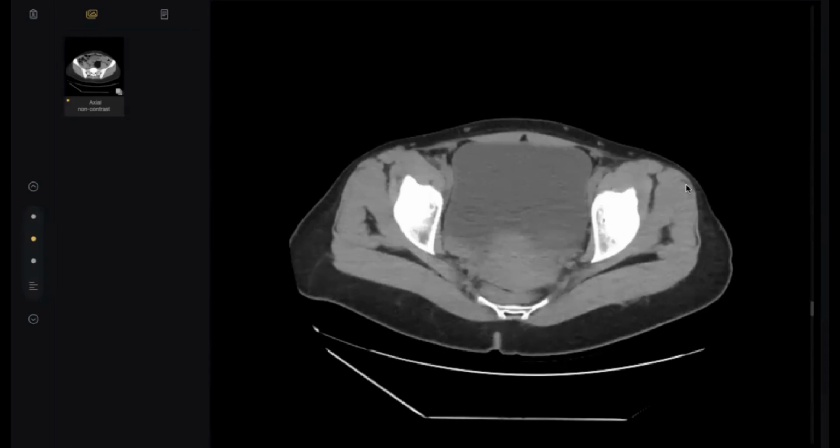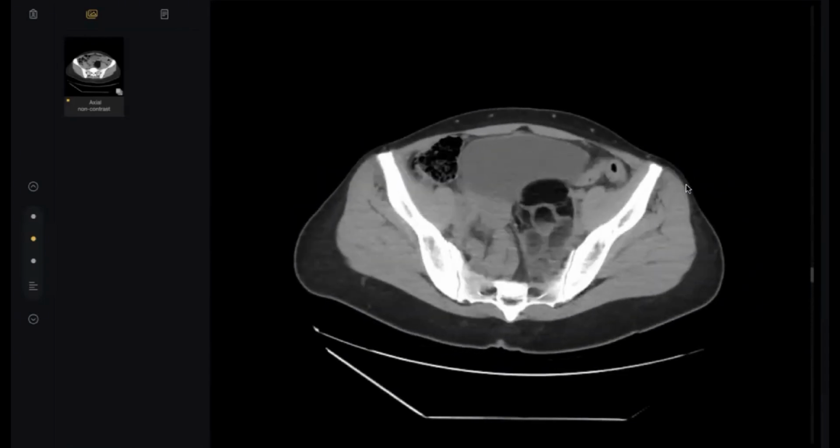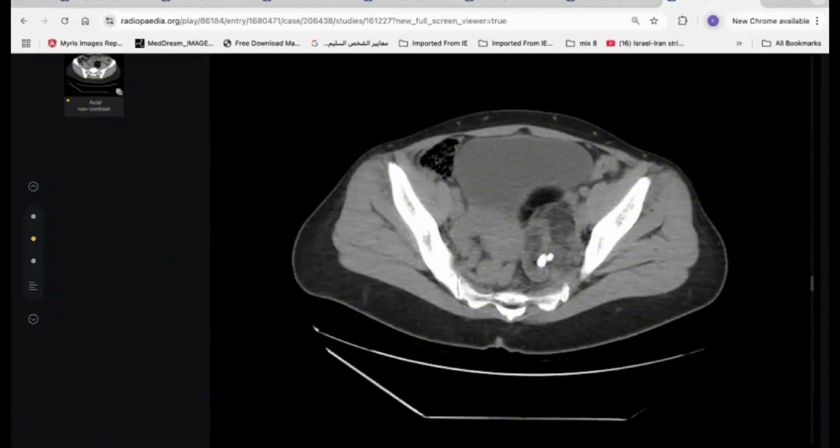Why? Look here. How many types of tissue here? Calcification is not ectodermal at all. It may be, I don't remember, either endodermal or mesodermal. And it has some epithelium. So at least two types. But in sebaceous cyst, it contains only sebaceous material, which is secreted from the sebaceous gland. The difference is in the number of layers: ecto, meso, endodermal.